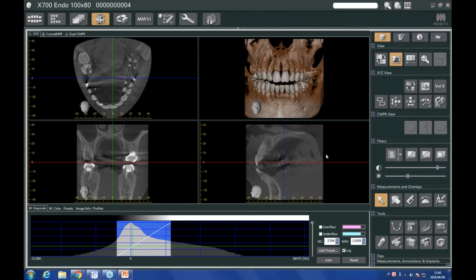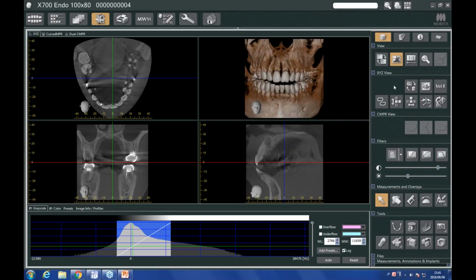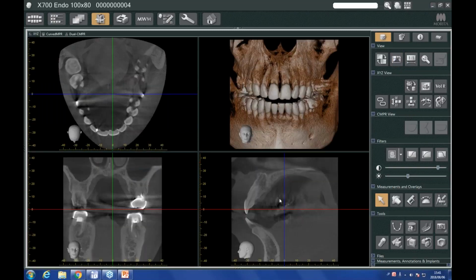Now, when I'm finished with adjusting my contrast, I usually want to just get this histogram window out of my way, because now the images are adjusted and I just want to focus on the actual image data itself. So this button up here that you can see is highlighted. I'm just going to click this, and that's going to hide my histogram view. If I ever need it back, of course I can click it again and bring it back. So it's just out of my way.